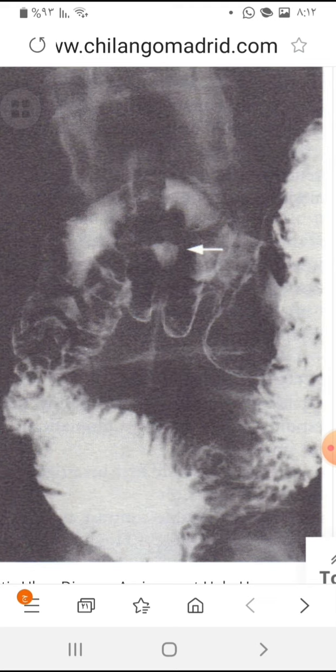In this form, the lesion is present within the dependent part, meaning the part where the barium will collect. If we turn the patient, the ulcer will occur in the non-dependent part, so it occurs as an area of translucency surrounded by contrast. So the appearance of the ulcer on an en-face image depends on whether it is present within the dependent or the non-dependent portion.